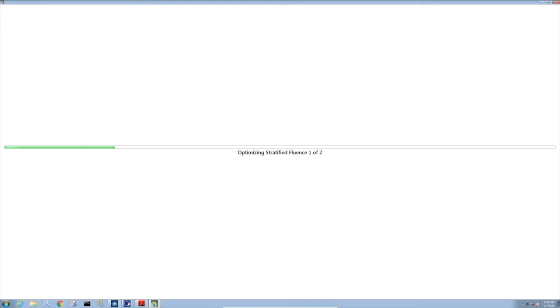So this now is going through and converting the ecomp plan into our field and field segments. Now, even though my max number of segments was set to 5, it won't always create 5 or the max number. So it's only going to create the number of segments that's needed for this type of plan.